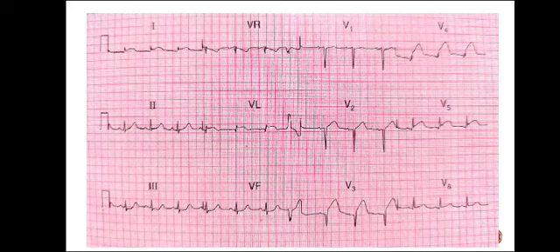In this last ECG, you can find a P wave in lead 2, so it's a sinus rhythm. Lead 1 and AVF both are upwards, axis is normal, and then you start looking at the P wave, PR intervals, and the ST segment from lead 1. Again, in lead 1 you can see the ST segment elevation. Lead 1 is a lateral lead, so the ST segment elevation is present in lead 1, lead AVL, lead V5, and lead V6.